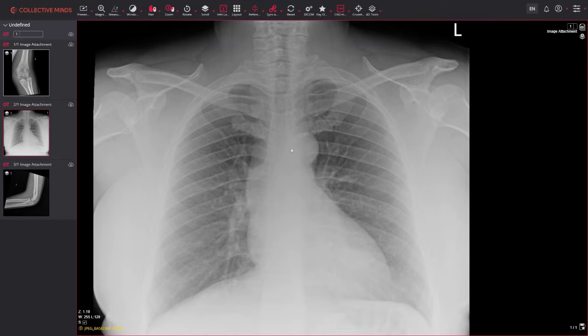Check for any evidence of previous cardiac surgery, if they've got any sternotomy wires, any prosthetic heart valves, any internal or external artifacts. Unfortunately, some patients may have some external clothing artifacts like necklaces, bras, etc. that have been really difficult to remove, and they've been left there, and that can obscure any underlying lung pathology. So it's important to comment on those as well, if there's any zips or anything like that.